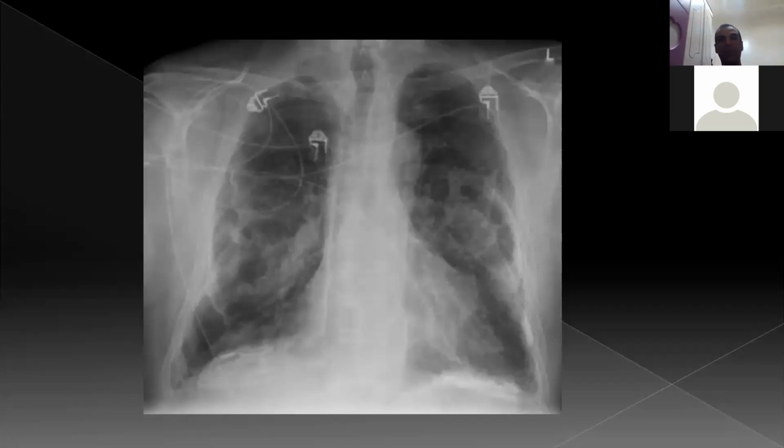Here, to finish up these pleural diseases, we have these leaf-like shadows. It's one of the most important opacities. You can see this is pleural plaques. It's classic or characteristic for the pleura. It's leaf-like shadows. It's pleural plaques. Sometimes you can identify calcified pleural plaques along the diaphragmatic copula.